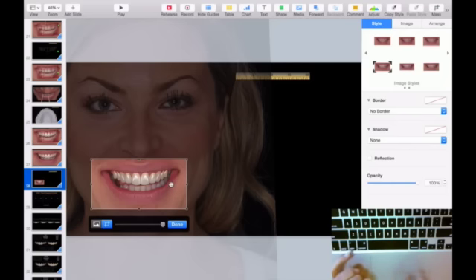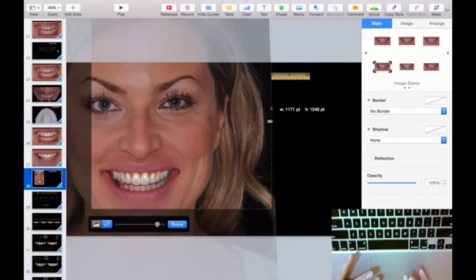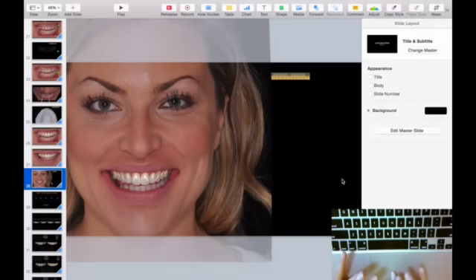And you double click twice, double click once, double click again, and you're gonna unmask her, because you masked it in the beginning, and you unmask it now to make sure you see beautiful Rachel with her new smile.